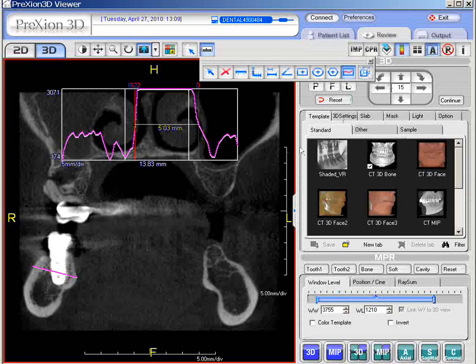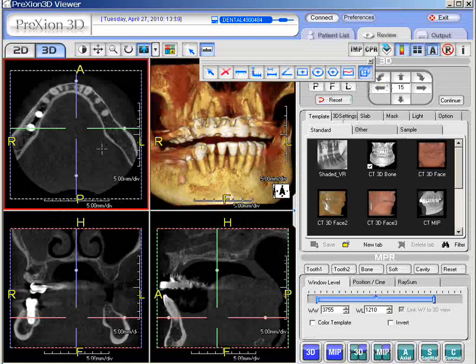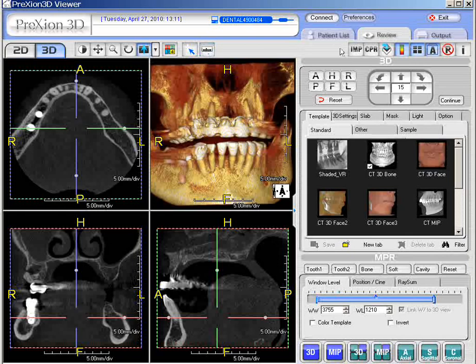Now the cube view here, we can basically ignore the 3D cube view. Even though we activate it, it doesn't really have a function here, so it's not necessary to even activate it. Remember that this software was adapted from medical software, so some items have transferred over from the medical grade software, and this is one of those features. To simply close out the toolbar, just click on the toolbar icon itself, and your measurement toolbar will go away.